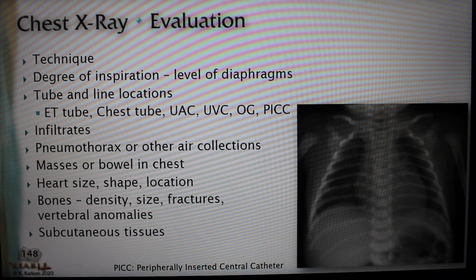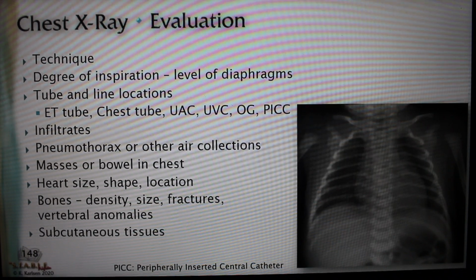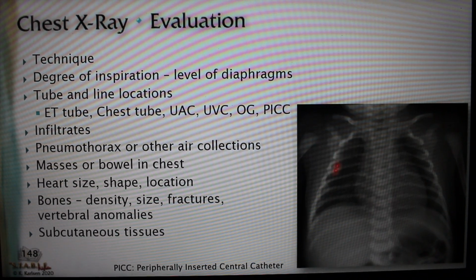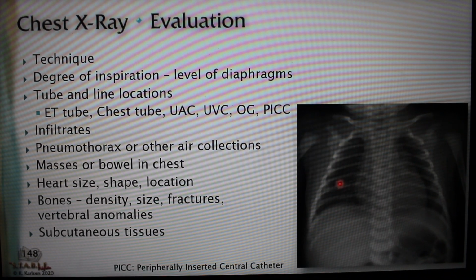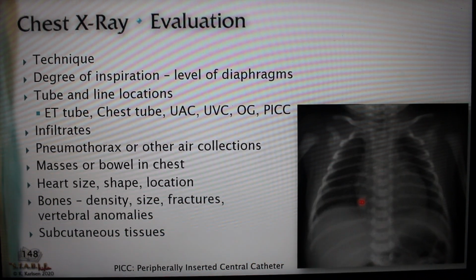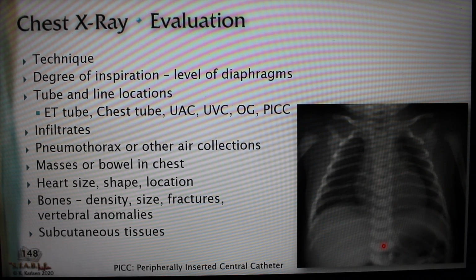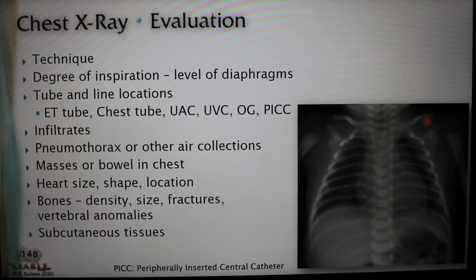In order to do that, we need to understand what we're looking at. So just remember, a chest X-ray is a system of soft tissue surrounded by bony structures, which are the vertebral bodies and mostly the rib cage. Remember that on a chest X-ray, anything that's dark here is mostly air. Any type of gray or white substructures you see represent fluid, such as the pulmonary arteries or the pulmonary veins, the vasculature inside the lungs. The large structure in the middle is, of course, the heart. Vertebral bodies come down the center, and the 12 ribs come off each vertebral body. Up at the top, we see the clavicles, collarbones.